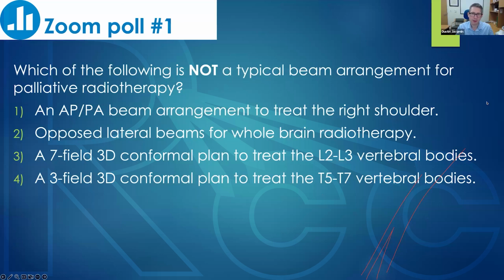So treatment time, both APPA and the conformal arc, I think the treatment time is really bound by how long it takes the gantry to rotate, because the actual delivery of a conformal arc is generally delivering more or less at maximum gantry speed. And so it takes about a minute to deliver the arc. The APPA, you'll deliver one field, you'll rotate down, that takes 30 seconds, you'll deliver the other field. So, maybe the APPA is a little bit faster, maybe 10 or 20 seconds faster, but they're pretty competitive with one another.